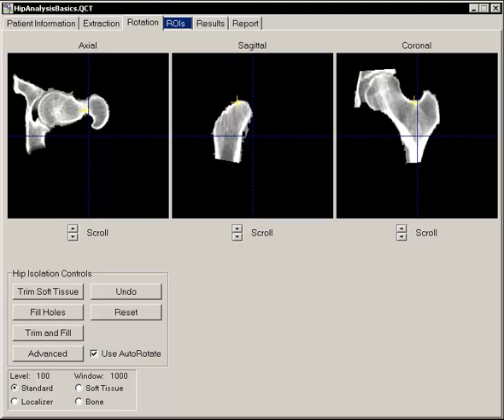These operations are automatic, but it is to be expected that in some circumstances the isolation and/or rotation will be inadequate. Adjustments must then be made, otherwise it may interfere in subsequent steps of the analysis and impact measurement accuracy and precision.